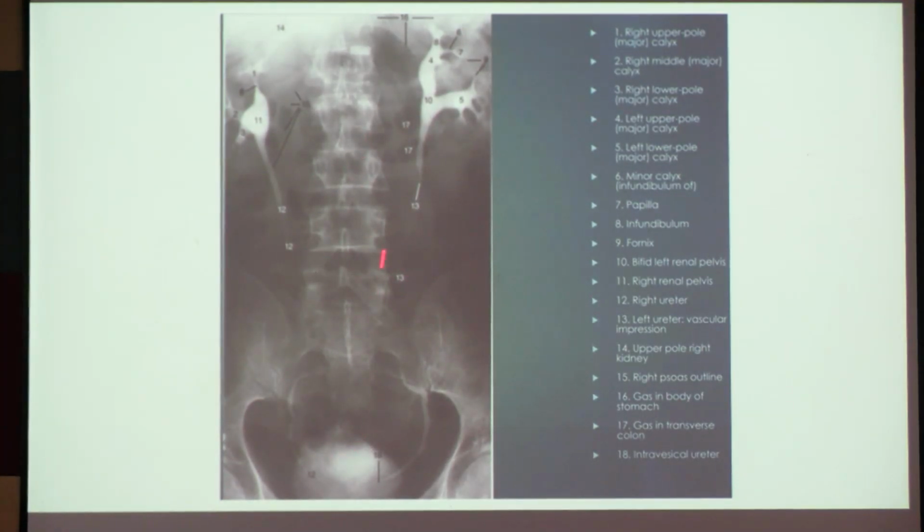So this is basically the whole length of the ureter. What is important is the other structures that need to be identified. If you are able to, then we'll just have an idea. There is a faint line which is going here, and there is a faint line which is going here as well. This is the line of the psoas muscle. Apart from that, there are these dark shadows. These are basically gaseous shadows.